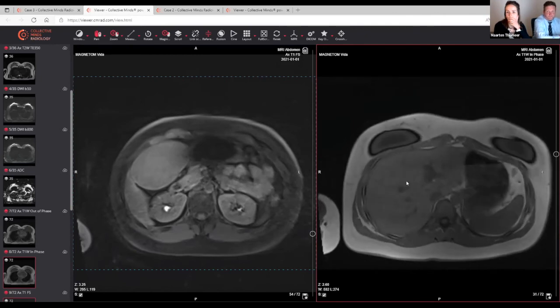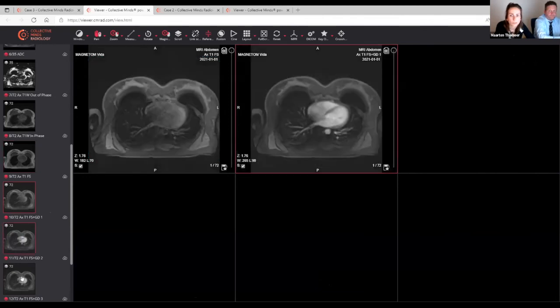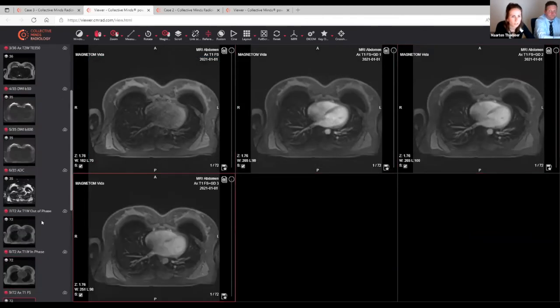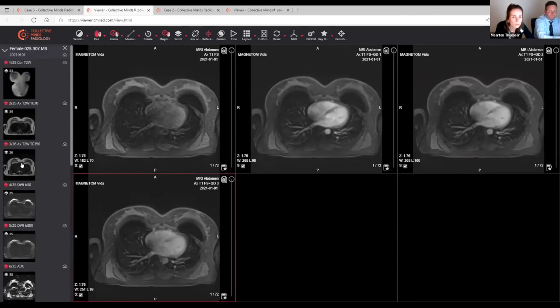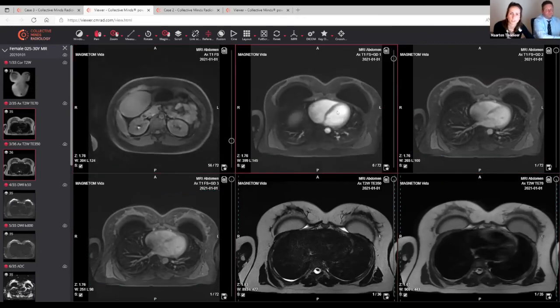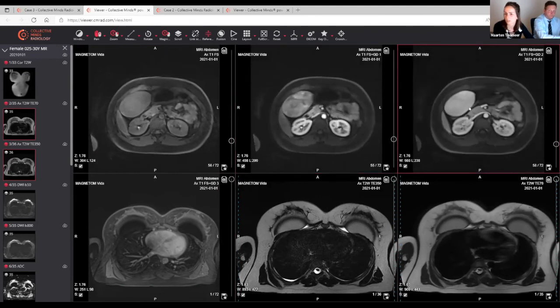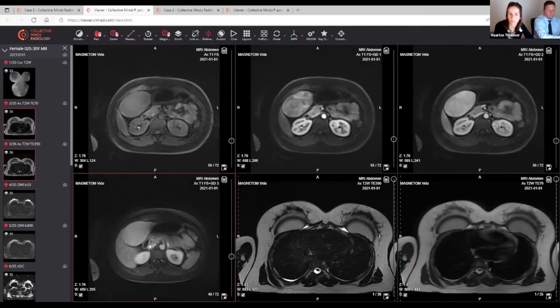That's important. Okay. Now go to the dynamic. I'll put them up again, and then I will take the T2 images. So iso-intense compared to liver with some hyperintense areas. In the arterial phase, we can see heterogeneous arterial enhancement. In the venous phase, it becomes iso-intense, slightly hyperintense compared to the liver. Still hyperintense. It's still heterogeneous. There are some more hypo-intense areas.